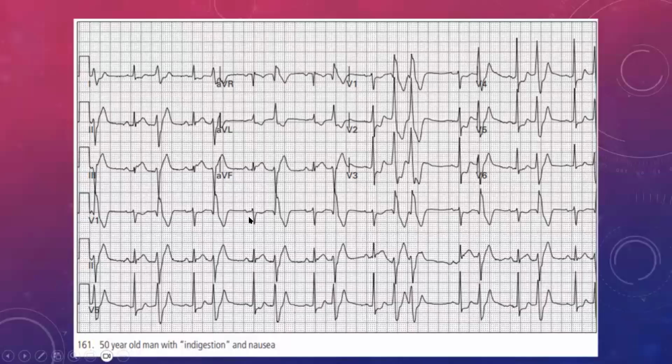And it could be a wide complex or narrow complex. Chances are it would probably be narrow complex, but it could be wide complex. So that means sitting in my emergency department, I know I've got to have everything ready in case this patient does go into a bradycardia, which we've discussed before. So I would have my adrenaline ready, my atropine ready. I would have my pads ready in case I need to pace this patient. And that's what I need to worry about.